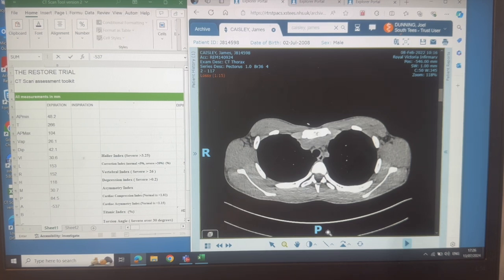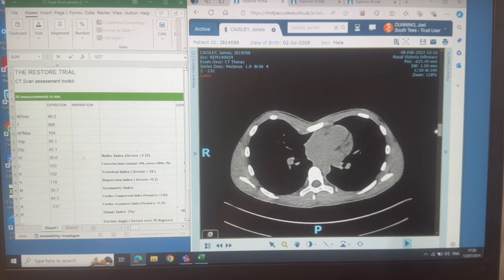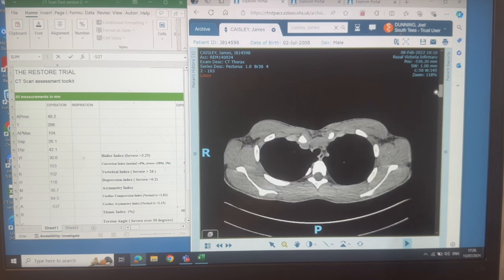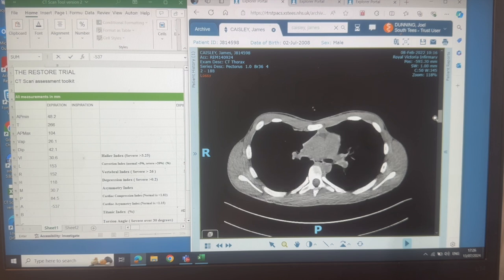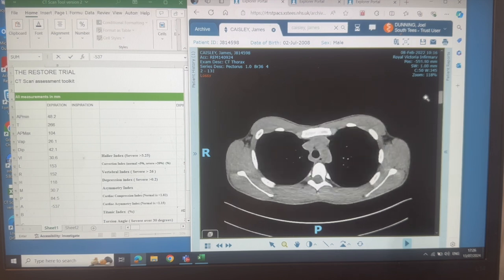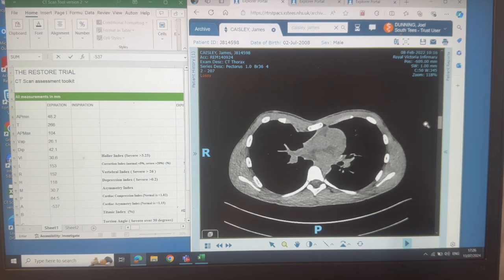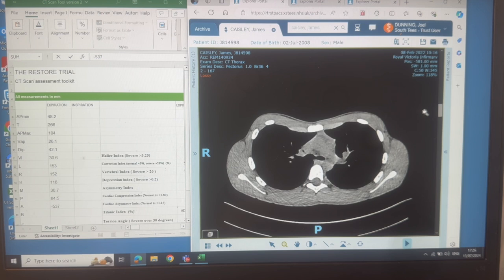Now, what you're looking for is at what point does that sternum start to dip away from this line? I'm not going to put that line in all the time, of course, but we're looking, when does it suddenly take a dip? Ooh, it's certainly taking a dip there, isn't it? It does a fun little break there as well, doesn't it? So manubrium, sternum, maybe it suddenly really starts taking a dip.